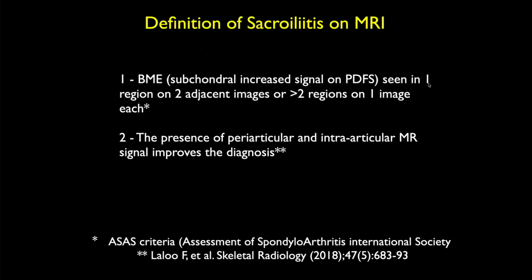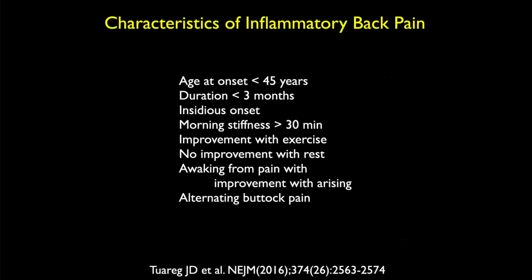And if it's seen in one region which is large, or two regions which are smaller, centimeter or less, then you have to be very suspicious. And you look for other areas to confirm it. Most of the time with these diseases, it's pretty definitive when you look at the edema pattern.